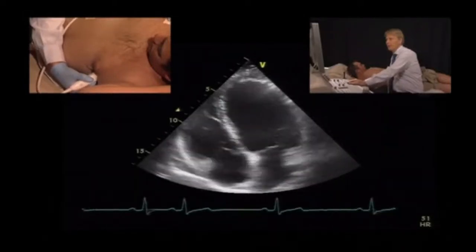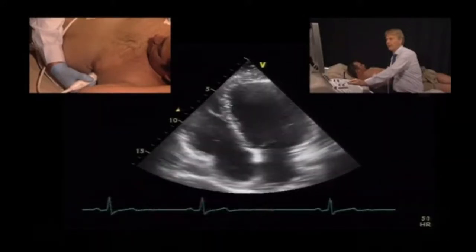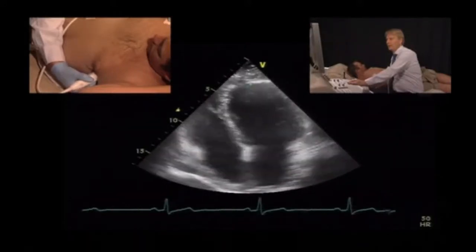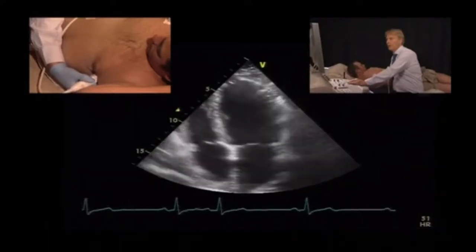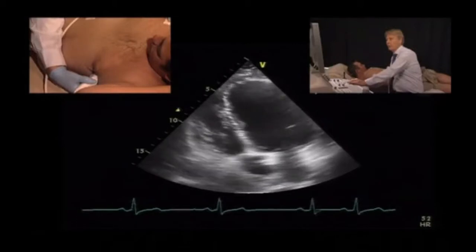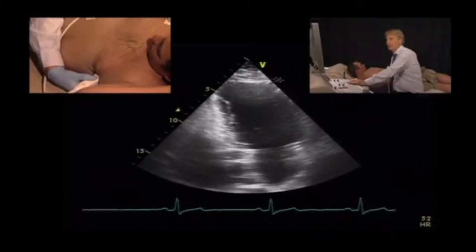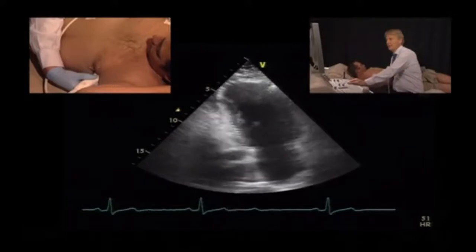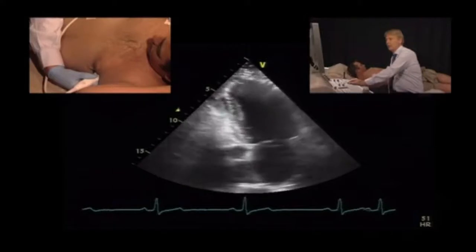This part of the septum still has normal wall thickness but seems to contract hypercontractile, while this portion here is scarred. There's a thin wall, and the scar reaches all the way to the distal lateral portion and shows some degree of dyskinetic motion. You can also appreciate that in the 2-chamber view, we see that there is a scar here in the apex, while the remaining part of the inferior wall contracts normally.